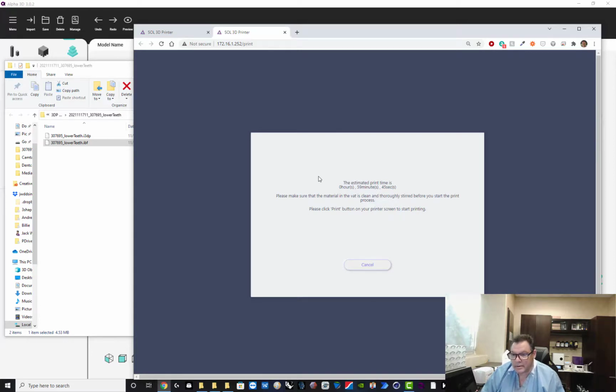So now I would go to the printer. I'm going to show you that next. Go ahead and launch the job. And before I do that, I'm going to show you how to clean the vat and go through some just typical printing hygiene that will help you be a little bit more successful with your print. So let me go ahead and turn around. I'll get to the printer now.